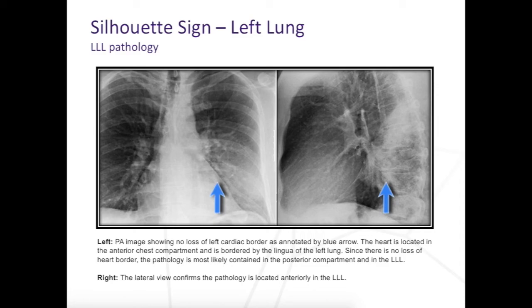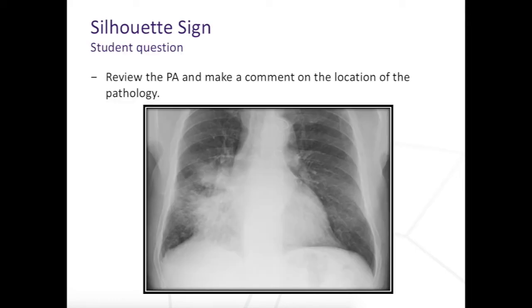But if you think about it in simple terms, consolidation is essentially a term used to describe the alveoli, the actual air exchange compartments of a lung, being filled with pus, fluid, transudate, blood, those kinds of things. So because of that, you often have these hazy appearances throughout the lung, but you can still see that the lung is functional, because a sign of consolidation is air bronchograms.